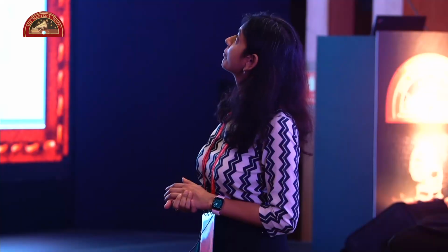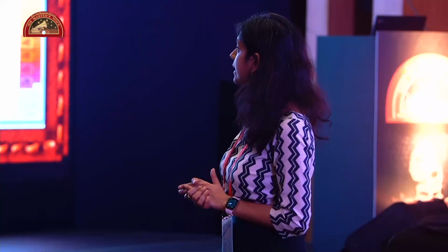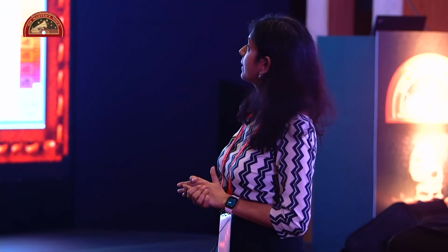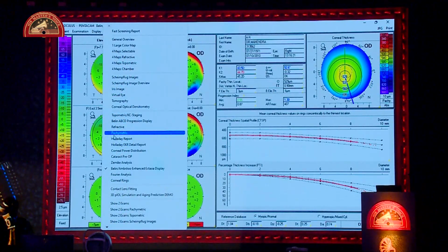Now first going to the refractive map. Here the map will give us the pupil diameter. In Pentacam we can also indirectly measure the angle kappa, which can be seen through the x and y coordinates of the pachy at the vertex from the pupil center. Coming on to the Belin-Ambrosio map, this shows BAD values to be perfectly normal.